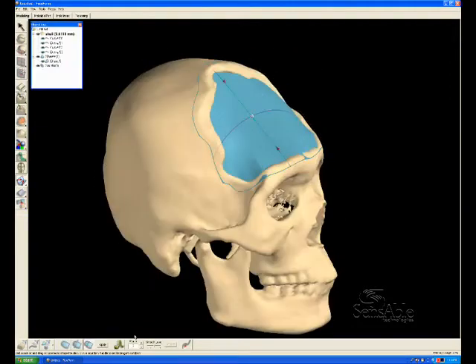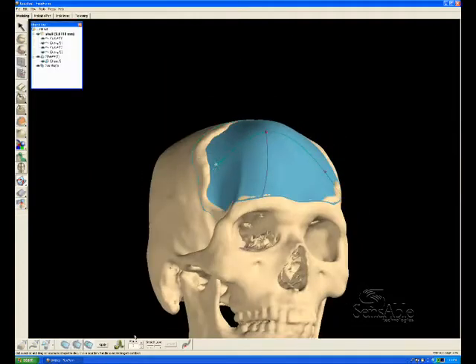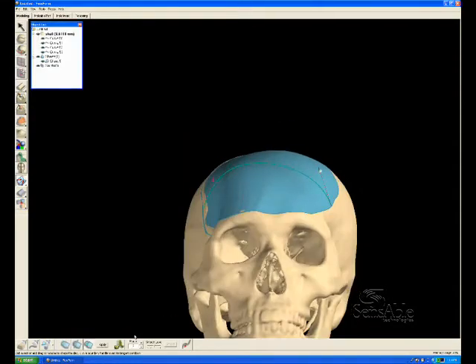Rotate the view often, haptically grabbing to the center crosshair, as well as the tangency handles on the ends of each spline. So rotate from the side to the top to the front. There's a haptic snap when you reach tangency, as well as that purple dot. That's a visual cue that you're tangent with the surrounding area of geometry.